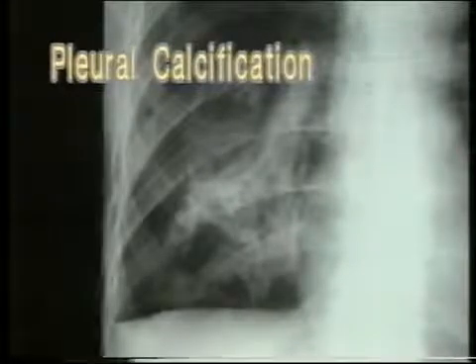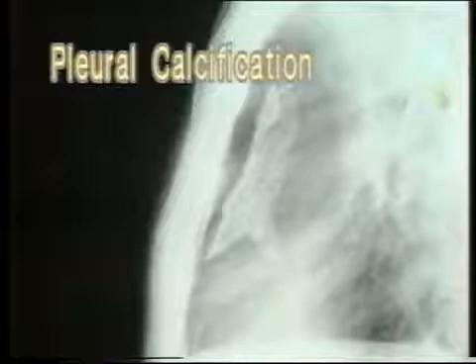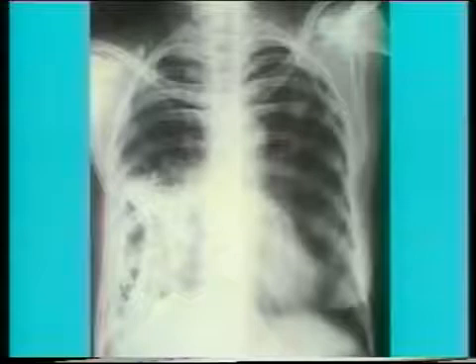If there is any doubt, a lateral or a tangential X-ray should be taken. The shadow of pleural calcification is seen to lie along the chest wall. This is another typical pleural calcification. It is a very dense and irregular sheet-like opacity with no fixed distribution pattern. Note the sheet-like opacity denser than the ribs with no fixed pattern.